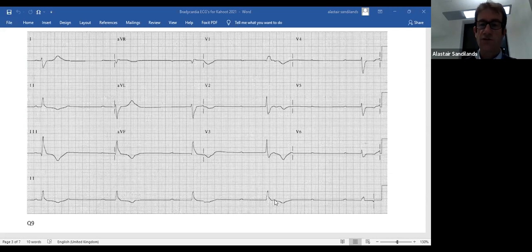You've got to imagine your sinus node always fires off regularly. So you can map these P waves, but there is no relationship of the P waves to the QRS. There's probably a P wave buried in there. Another one, another one. So the P waves fire off regularly, and there's just no relationship at all.